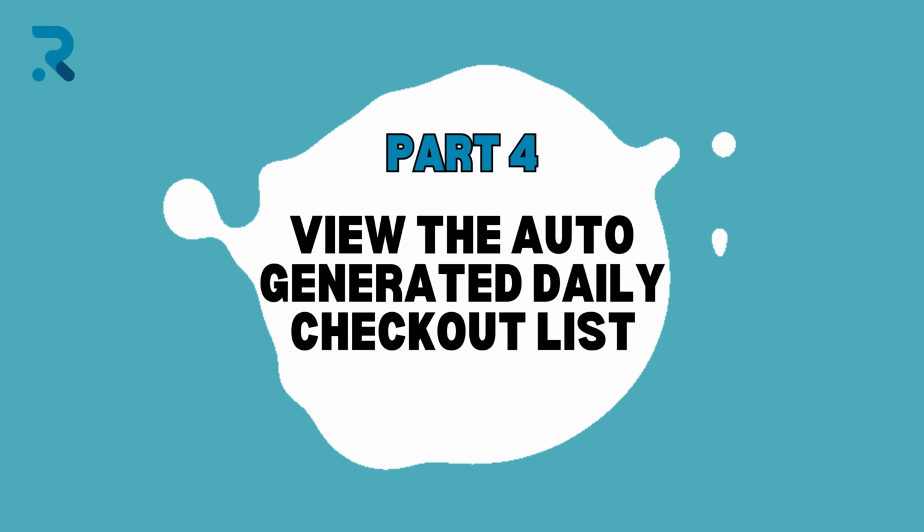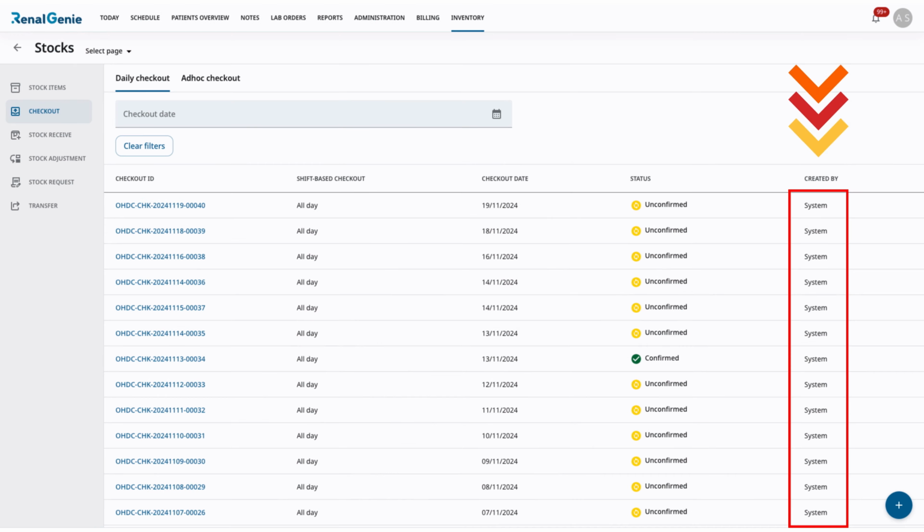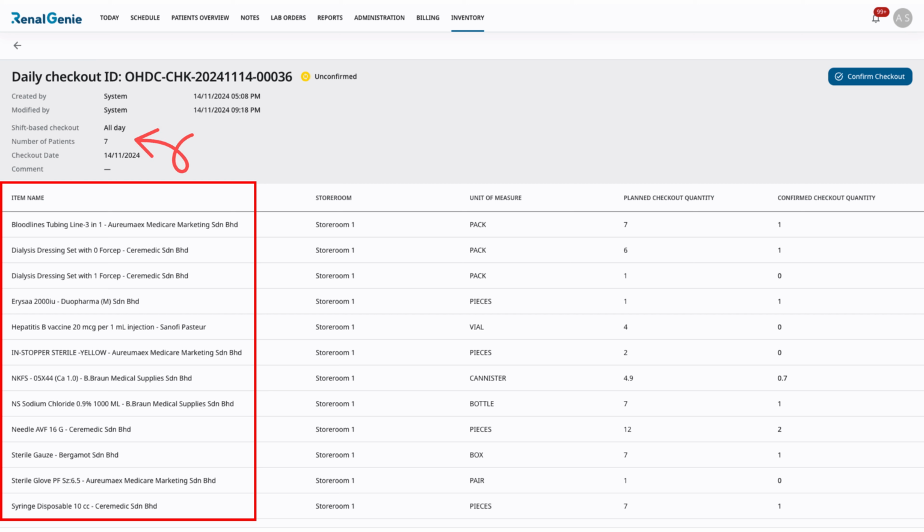Part 4. View the auto-generated daily checkout list. In this new feature of the RenalGenie inventory module, system will auto-generate a daily checkout list. RenalGenie, with its smart logic, assists the user by listing all the items to be checked out on the next treatment day based on the number of patients scheduled and their access type.